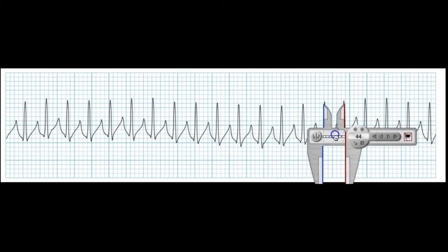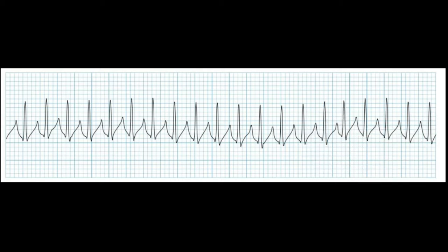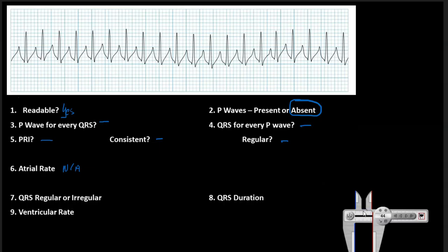And this is indicating to me that this is, I don't want to say the word dead, but it is dead regular. There is no change that I am seeing here. So I'm definitely going to say that this is regular. Usually, this is dead on regular, meaning that there's no R to R variability. So there's no R to R variability like we see with a sinus tachycardia.